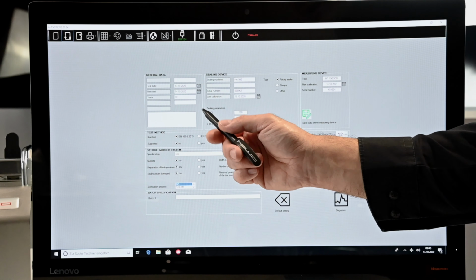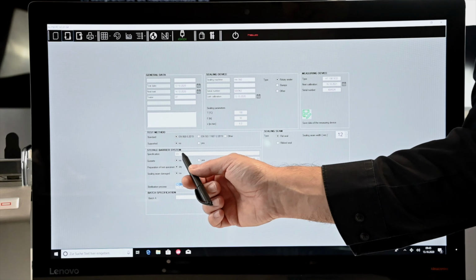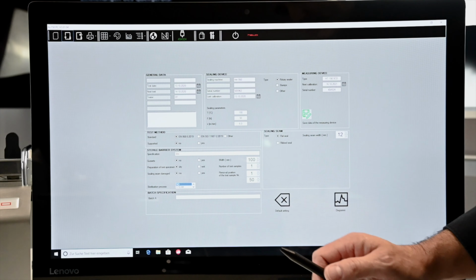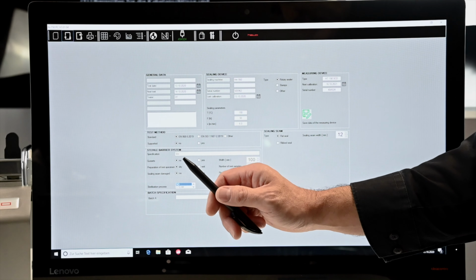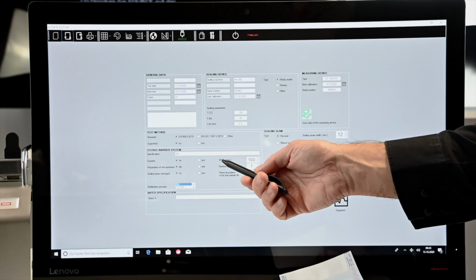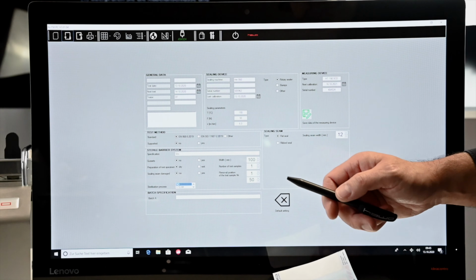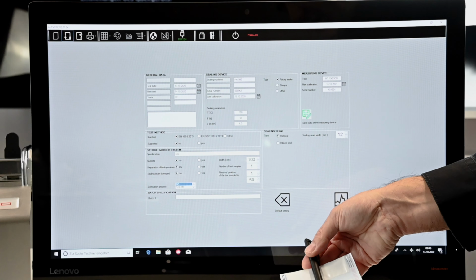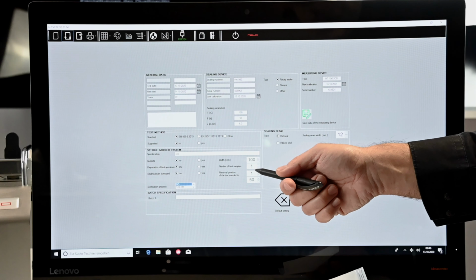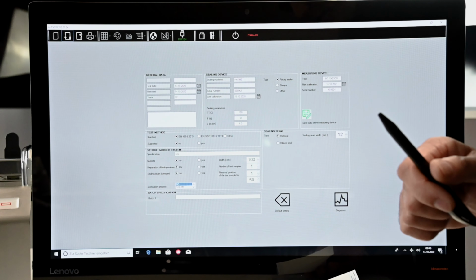Last but not least, information on our sterile barrier system, which we will abbreviate now just as SBS: whether or not the sterile barrier system shows gussets, how the specimen will be prepared, whether or not the sealing seam is damaged, the width of our sterile barrier system, here 100 millimeters, how many samples we are going to take, and it will be one sample from the center, so we have the one here, and the removal position or cutting position for sample number 1 will be in the middle, or 50 millimeters respectively.